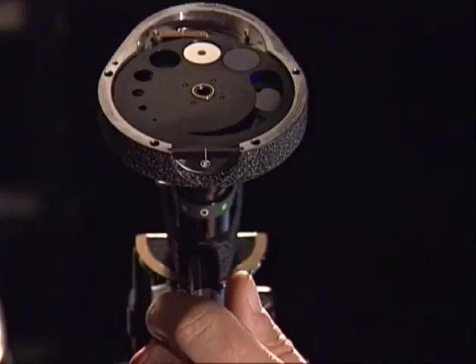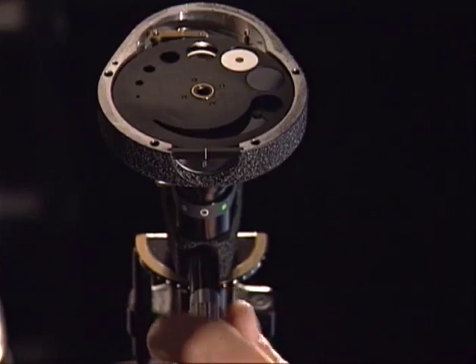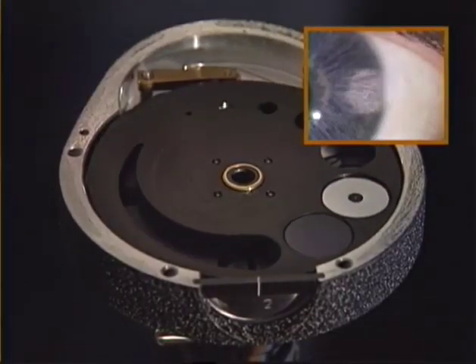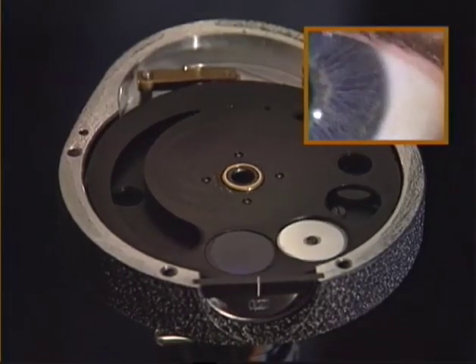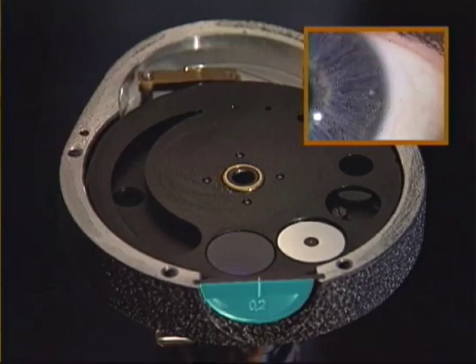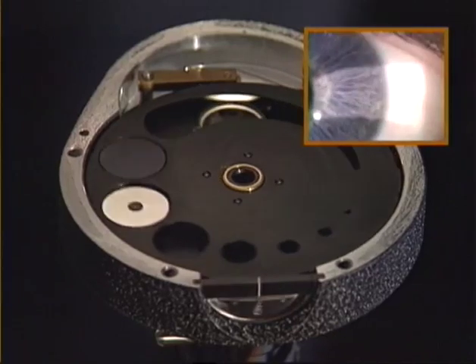A bird's eye view with the top of the slit lamp removed shows circular diaphragms for changing the beam size stepwise. The actual diameter of the slit is shown on this scale and can be used for measurements at the eye surface. Here is an oblong diaphragm for a continuous change.